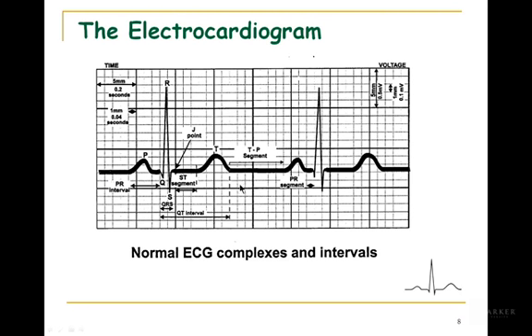So when we're looking at the EKG, there's 3 rules to keep in mind. What you're looking at is the average current flowing in the heart at a particular point in time. It's the average. When you look at the P wave, we've already known that it represents depolarization of both atria. When you look at the QRS complex, you're looking at depolarization of both ventricles combined.